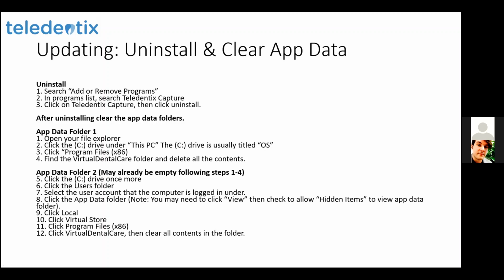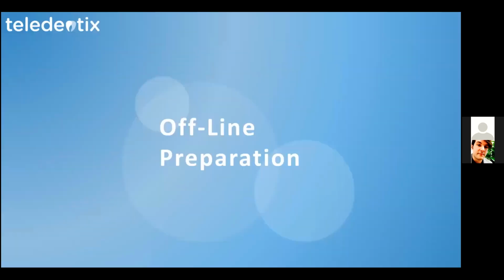I actually had to do this. So I uninstalled it from my personal computer. I cleared the app data that you see here. All of this will be sent to everyone here. And I reinstalled it and I was fine. I'm like, okay, this was surprisingly easy. So with that, I'm going to hand it over to James so he can walk us through a little bit more detail with clearing the app data. I'm going to stop my screen here.